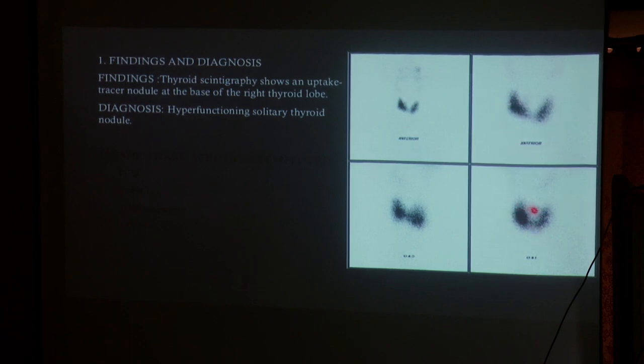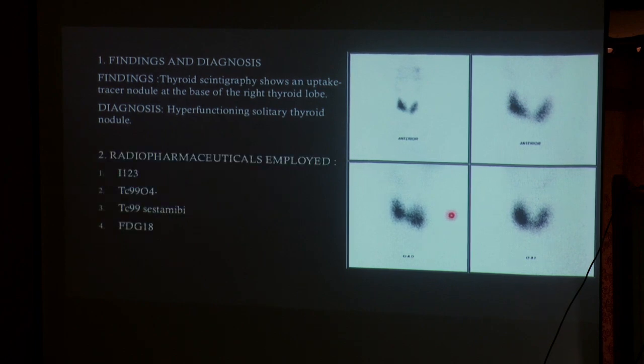This is a dark colored structure over here. That's a hyperfunctioning solitary nodule of thyroid. The rest of the gland does not show any uptake, or there is no defect as such that's seen here. The radiopharmaceuticals, yes, sestamibi can be used.